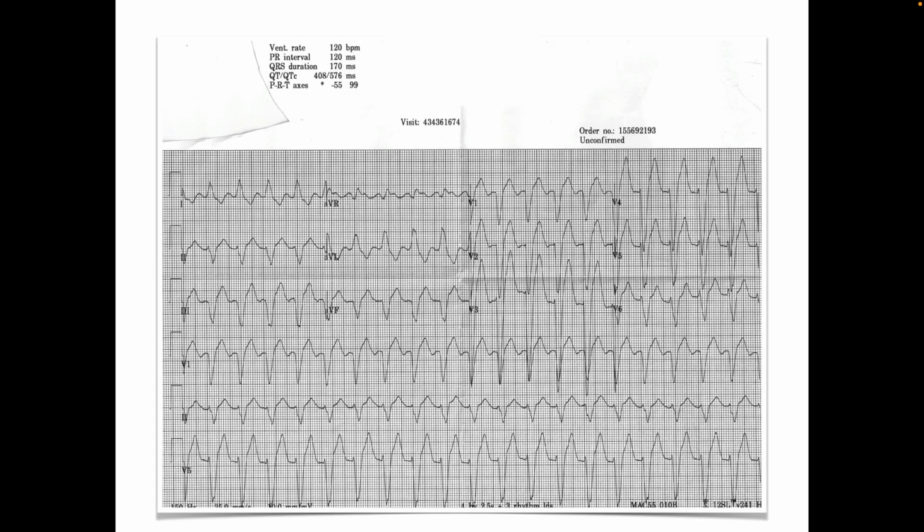I'm going to start with a warm-up 12 lead, and I don't know if you can see it in the back. You can always move up, but I know the people in front can see it. So what do we think this is? Pure ugliness? Is that pure ugliness? Well, yeah, that too.